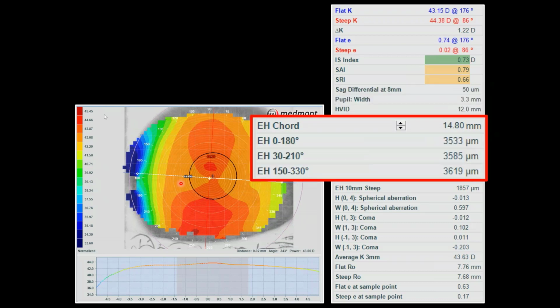Now, these EH chord attributes are valuable for you if you're a scleral lens practitioner. For me, the scleral lens I use is a 16.3 diameter that lands at 14.8 millimeters diameter. Its sagittal depth is calculated and labeled according to its measurement of 14.8.